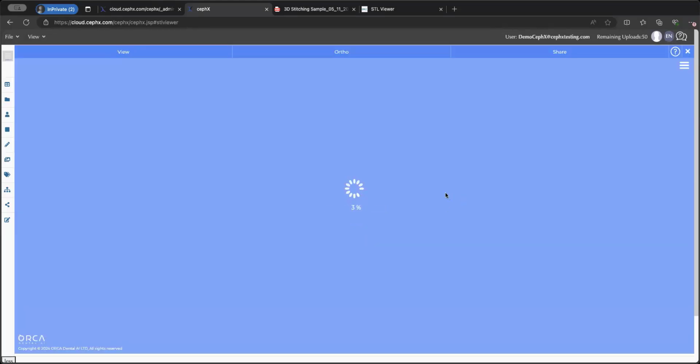And again, in this case, I don't think the iOS was uploaded, so you only have the segmentation of the CBCT. And the internet is doing its thing right now. So we're going to have to wait patiently. But yeah, once it gets a burst of energy, it likes moving at a more normal speed.